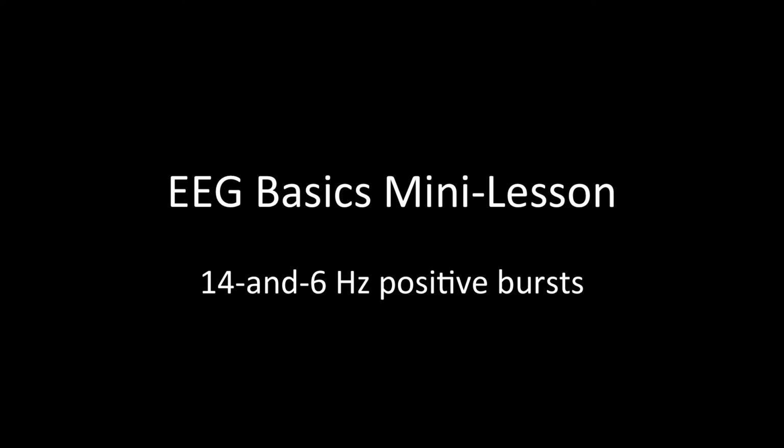This is an EEG Basics mini lesson focusing on 14 and 6 Hz positive bursts. These are also known as 14 and 6 Hz positive spikes, or sometimes 14 and 6s. This is a normal EEG variant not thought to be associated with epilepsy or any other disease. These are relatively rare but important to recognize when interpreting routine and prolonged EEG recordings.